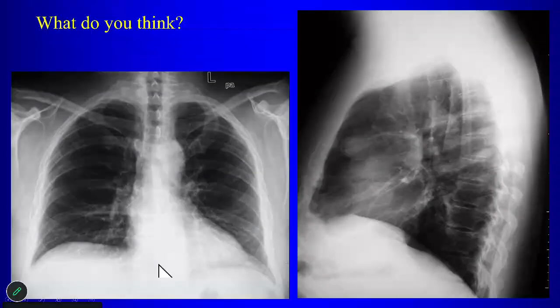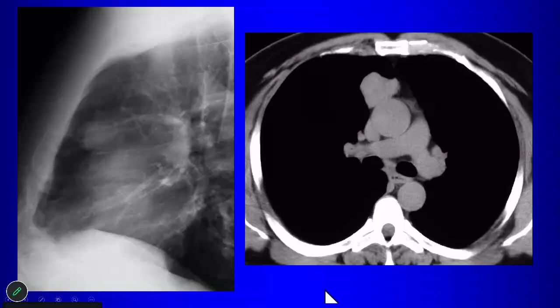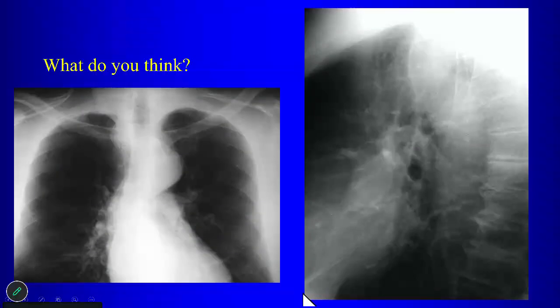Of those 3, which one is filled? Which one has an abnormality? Yeah. So what compartment is that? Anterior mediastinum. What do you think that is? This turns out to be a thymoma, right? So that's in your differential. It's a kind of a nodular mass, smaller nodular mass that you might go with thymoma.